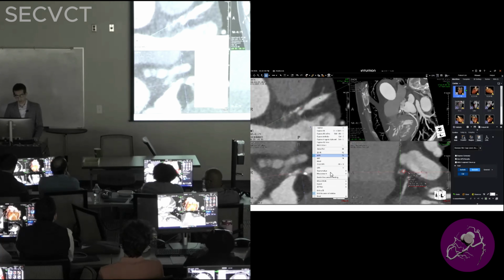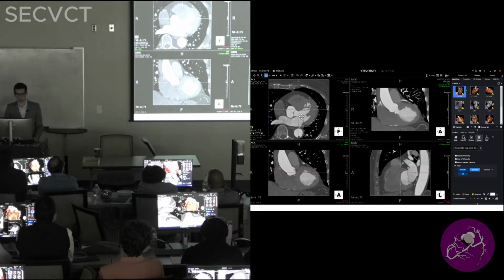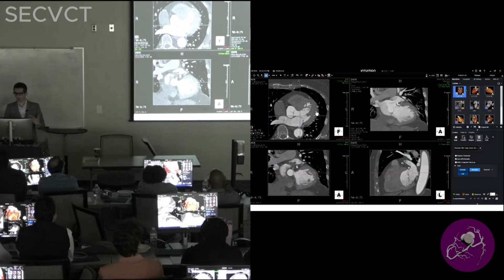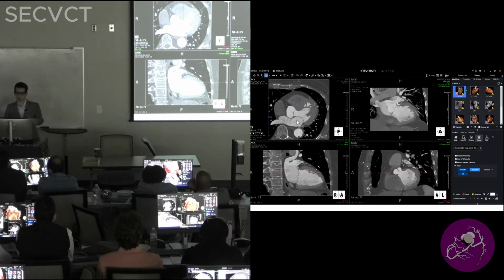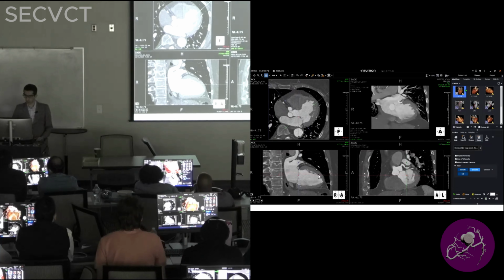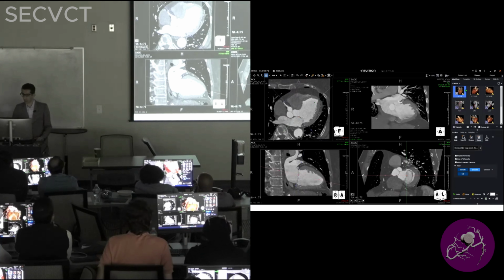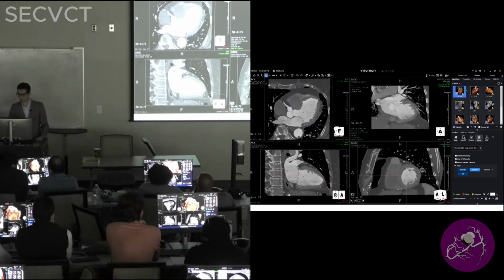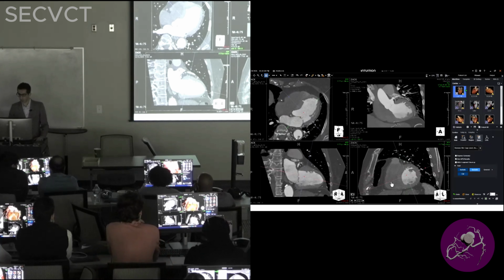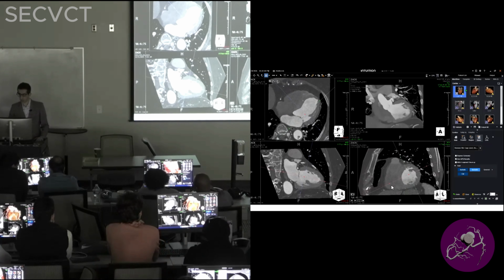Go back here. That's a good point. So what to do with these clefts? So the way, just quickly to show you how I like to create my short axis, I always start with the axial, which is the fake 4-chamber. We do it on MRI all the time. Now I have a fake 2-chamber, open the apex on the 4-chamber, and now you start having a short axis from here. You will go ahead and double oblique to open your ventricle, try to find the papillary muscle, the anterolateral one, and then try to intersect it to some degree and cut the RV free margin.